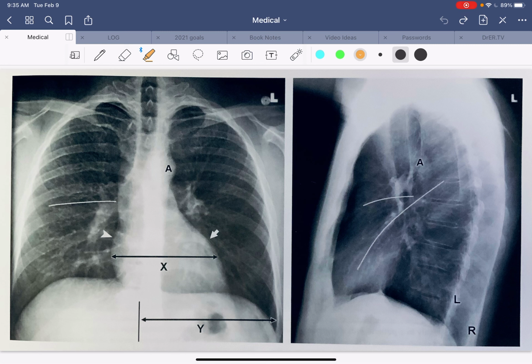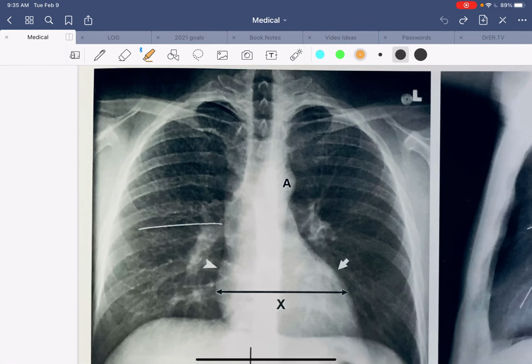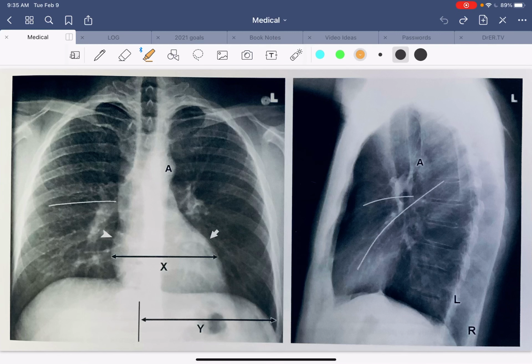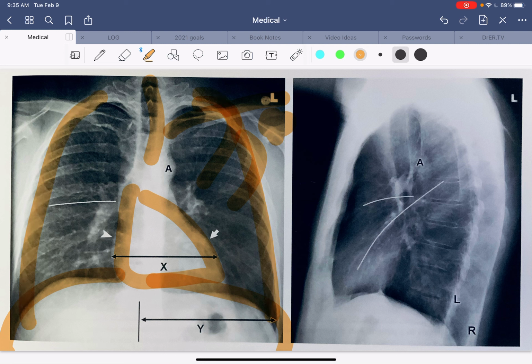In this series, we're going to do radiographs, and we're doing x-rays of the chest to start with. This is both the AP, anterior posterior chest view, and the lateral view of the chest. And we're going to try to see if we can recognize the different structures. As we described in the previous video, main structures: clavicle, trachea, ribs, shoulder, heart, diaphragm, and of course the chest and everything else, okay?